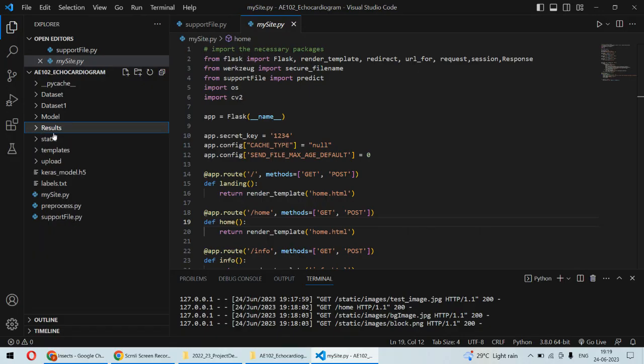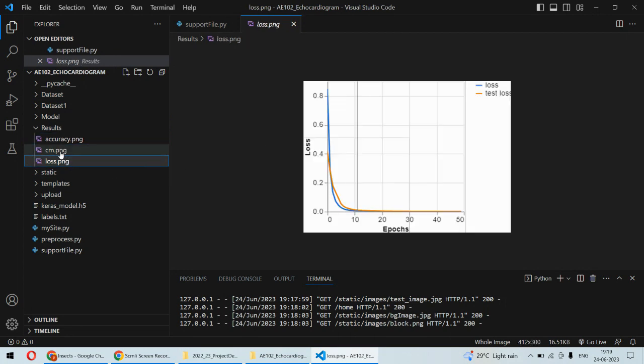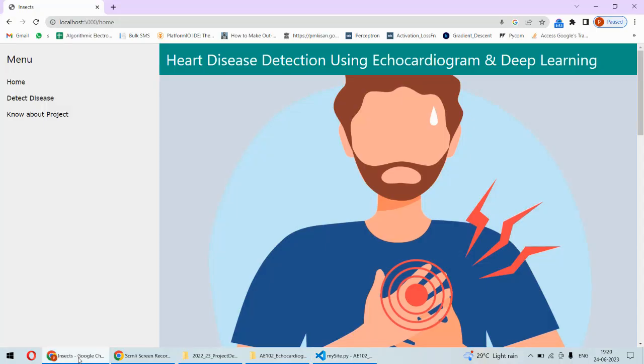After we have trained the model, we have this kind of accuracies, which is quite high. It's good accuracy. Also, the loss curve is better, and this is how we can expect the results from the convolutional neural networks. So as the CNN is used, the deep learning algorithm has good accuracy. And now let's talk about how to run this project.